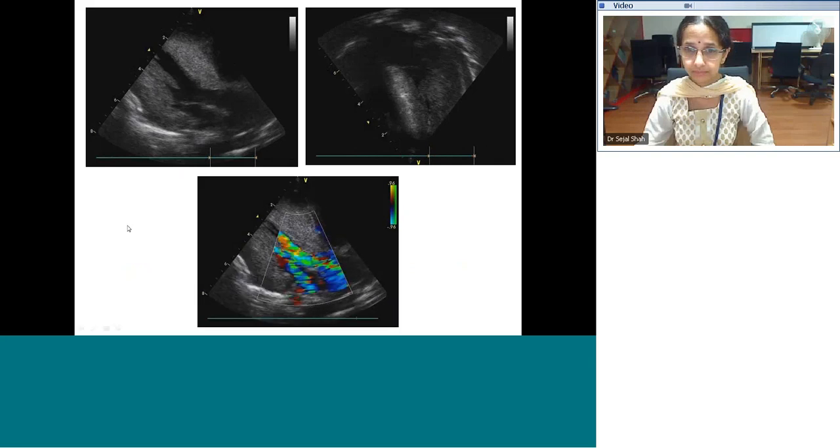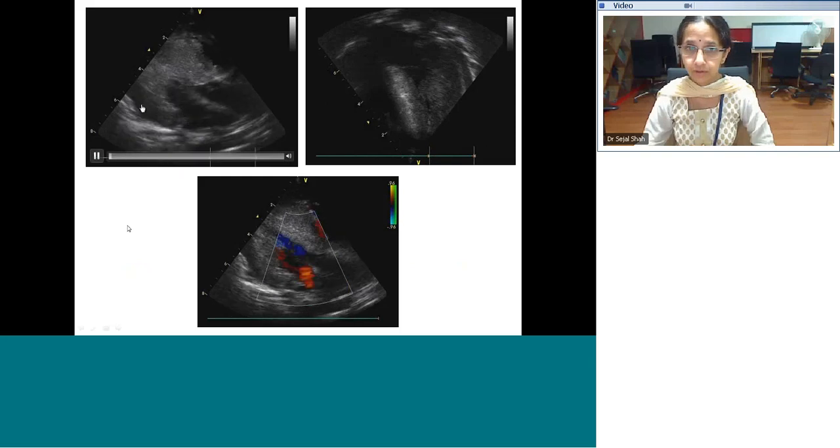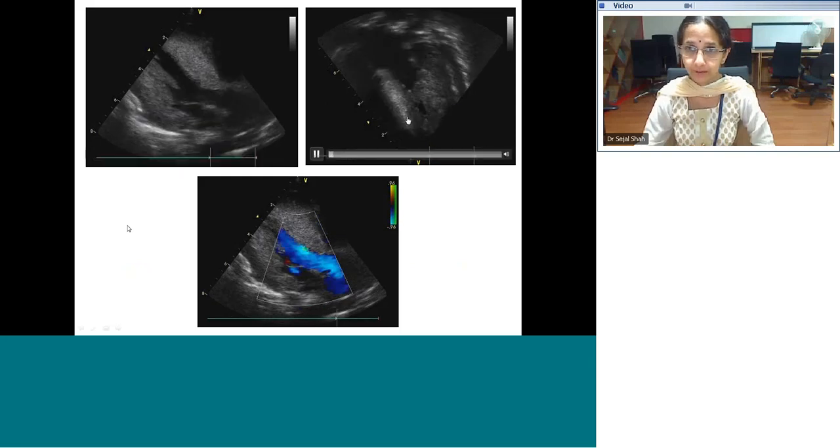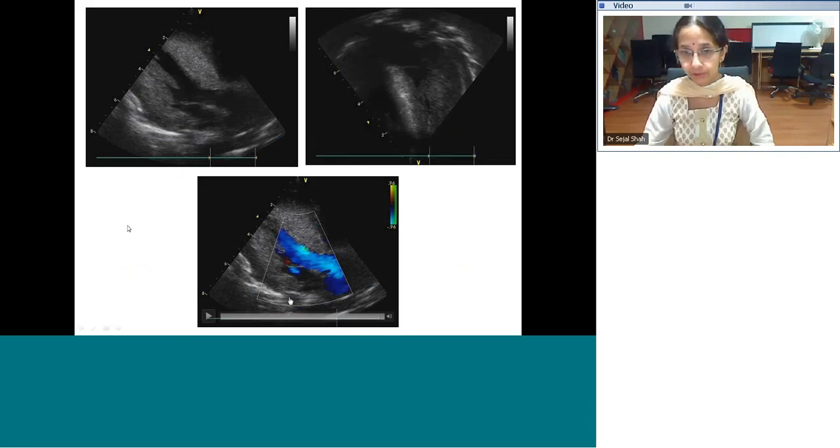I'm sure all of you know what's the diagnosis in this child. Cardiomyopathy is one area where we commonly do not see such cases, and also that we commonly do not do a complete echo understanding for these babies, and hence this slide. So the diagnosis, I'm sure, yes.